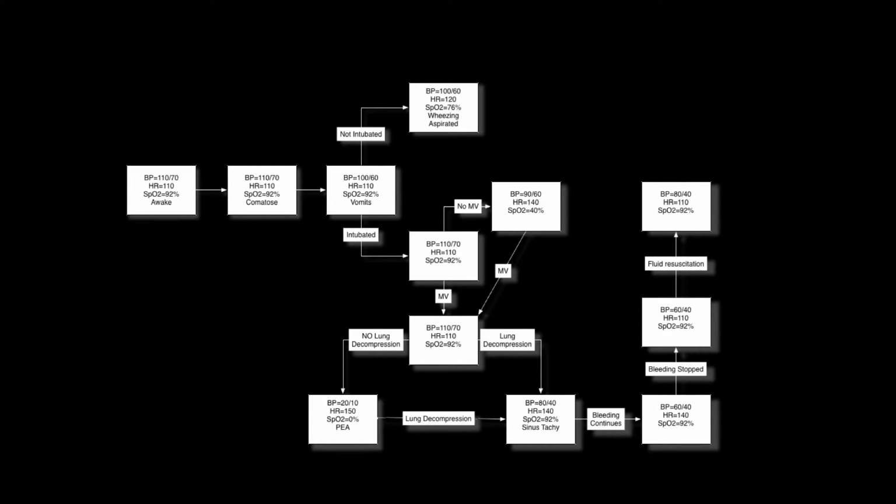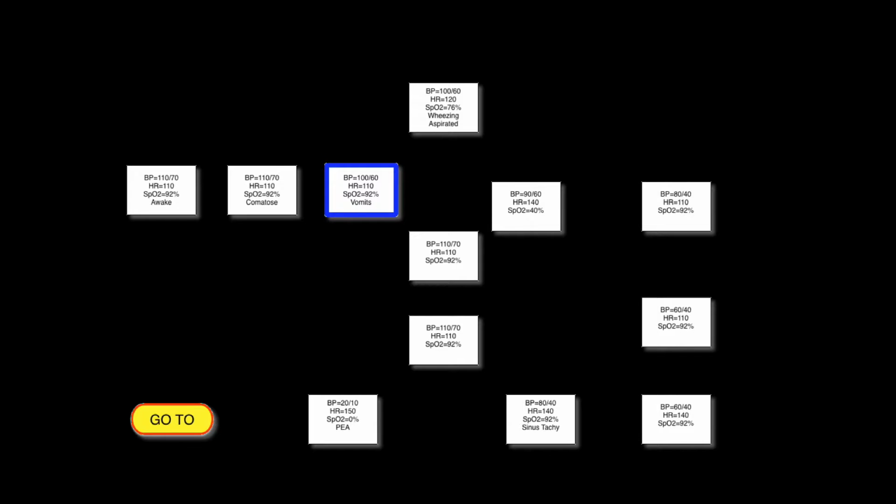The typical scenario looks something like this. All these frames are connected to each other. They flow basically in one direction and rarely move backwards. We create pathways and hope that learners follow one of them. Our programming concept is slightly different. We eliminate all the connections and add a go-to or a hub where the previous settings reside.